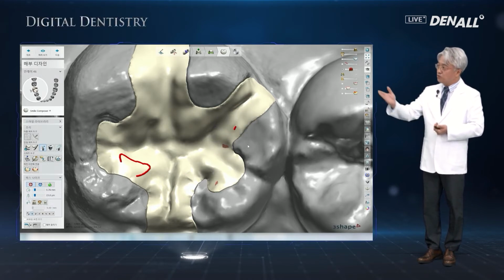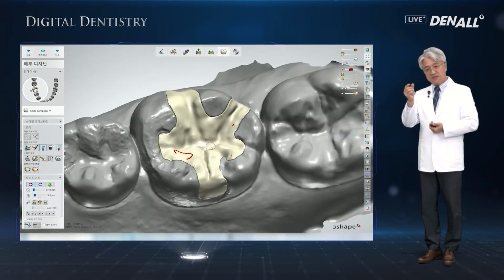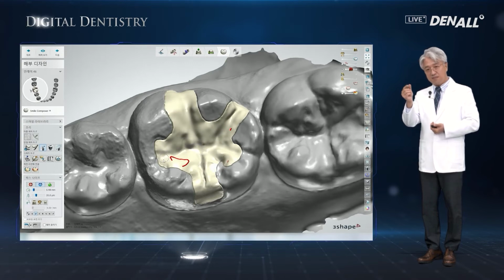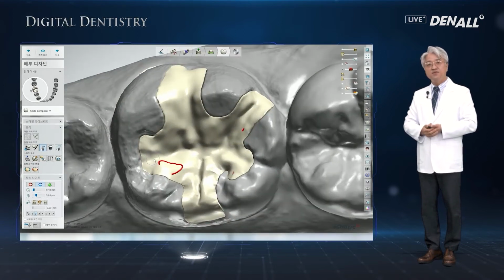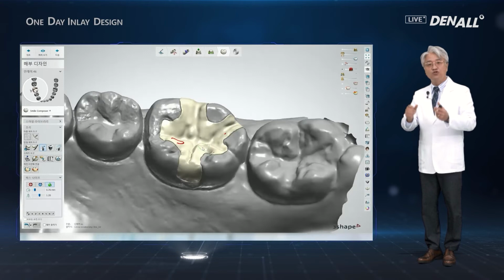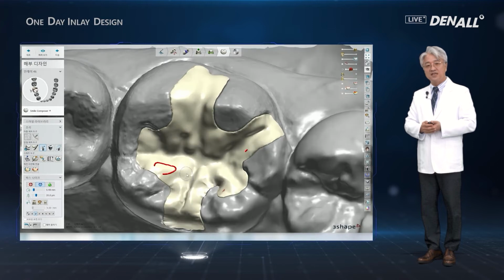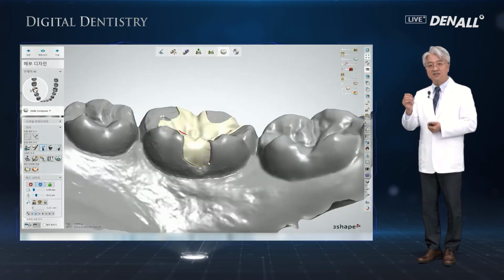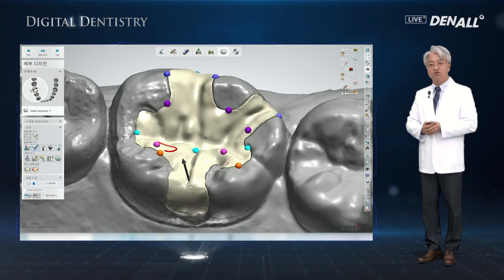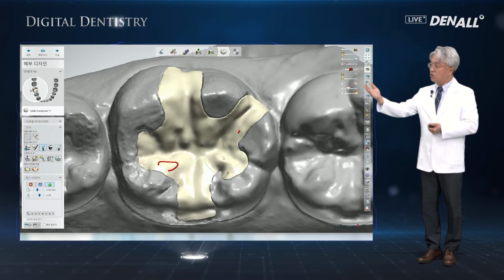So for the groove or thickness, the minimum thickness on the software side, if you put in the limit or threshold values in the system first, for ceramics or hybrid resin or other materials, with their properties or set values input, then there will be no problem in creating prostheses in milling. In other words, a stable result can be made in the system.